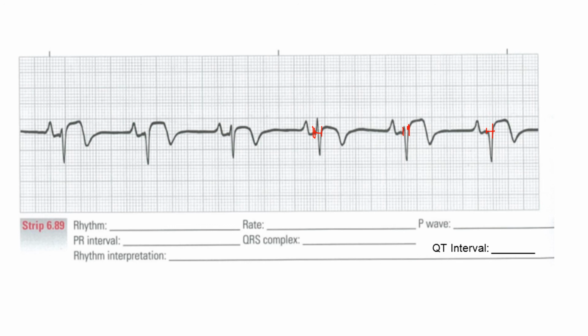Your QT interval. Now the challenge is that you have T wave inversion, so you're going to measure from the beginning of your QRS to where the T wave comes back up to the isoelectric line. I'm going to try to get another one from the beginning to where it comes up. So you're going to measure your QT interval, and it looks like about 10 boxes, maybe 10 to 11 boxes. So your interpretation of this rhythm is sinus, and the heart rate is less than 60, it's 54, so we're going to call this a sinus Brady.